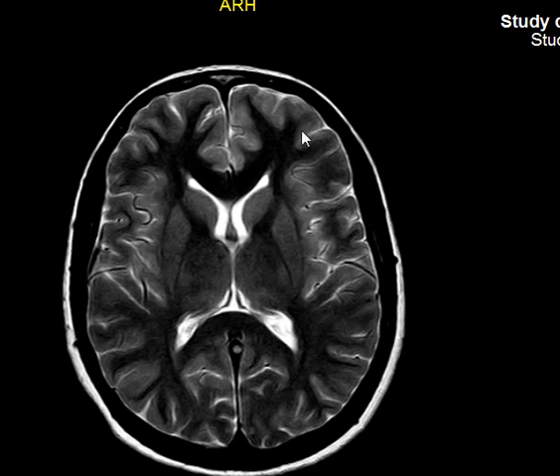On the superficial, you see this. And on the deep, you see this. The deep ones we call the basal ganglia. What are the basal ganglia that we have? First, anteriorly, this one is the head of the caudate nucleus. It's not the whole caudate, it's the head of the caudate. The caudate nucleus is a very big, very tall one. This is just the head of it, part of it.